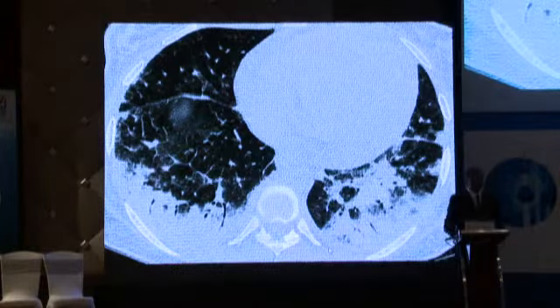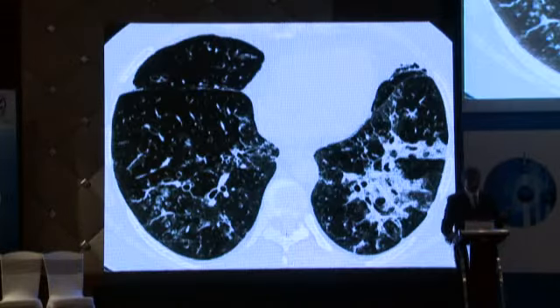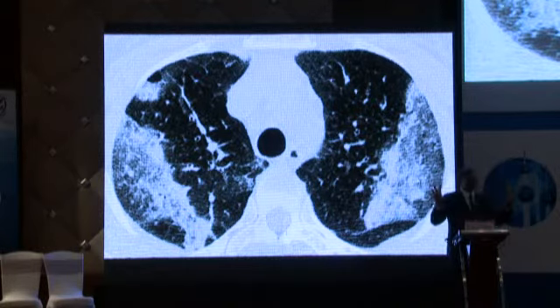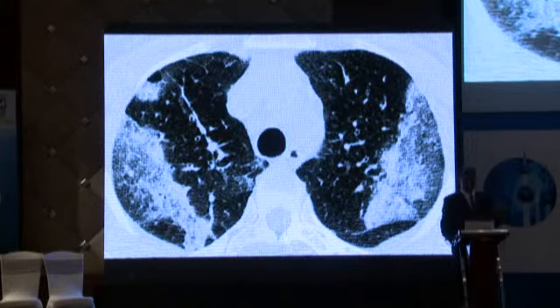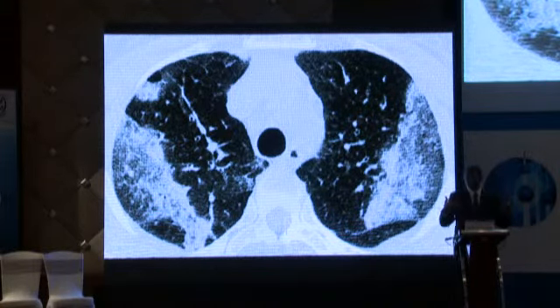There is one interstitial lung disease that presents with consolidation. We have bilateral subpleural. You can have bilateral peribronchovascular. Usually there is an element of associated ground glass, and as in this case, this looks like a bilateral reverse bat wings, bilateral peripheral mixture of consolidation and ground glass attenuation. These patients present with fever and Velcro rales on auscultation with a 3 to 4 week history.